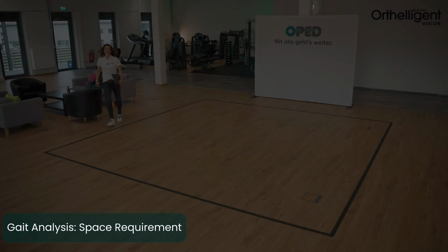The patient can wear his casual clothing. Ideally, it is without pattern. The measurement can be done barefoot, with shoes, or with prosthesis.